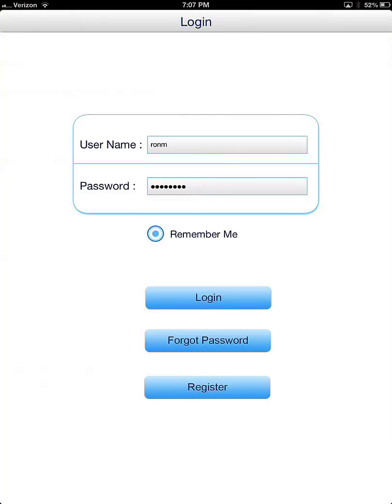Documentation. The app has 14 major assessment screens, equipment demonstration, and service device editor. There are 17 report options. To get started, remember all fields with an asterisk are required fields.